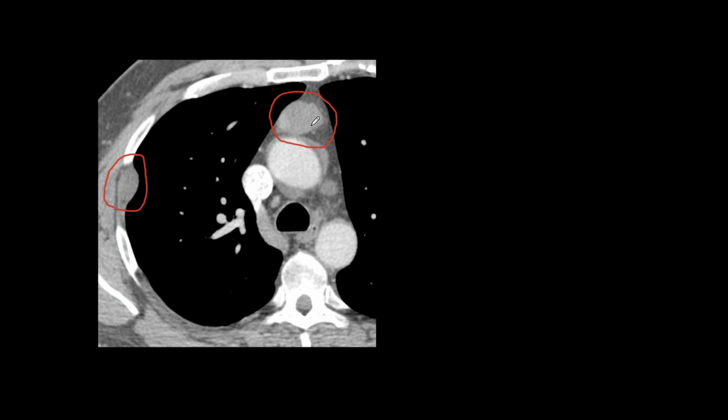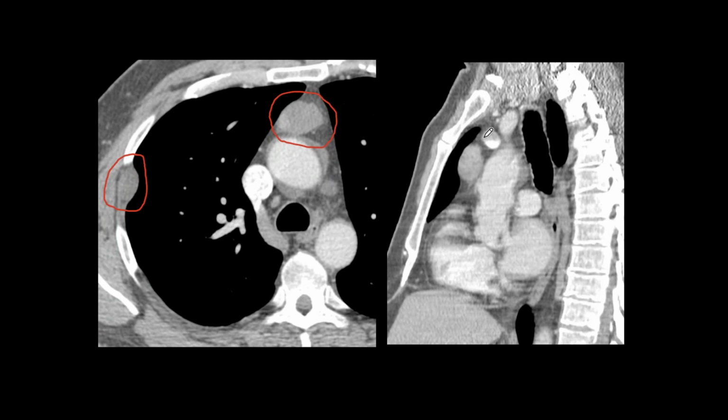I knew that this is more likely a thymoma, and I knew thymomas metastasize along the pleural lines. So I thought it was a malignant thymoma with metastasis in the pleural region on the lateral chest wall. This is a lateral view. There you see how this thing matches what we saw in the lateral chest view.